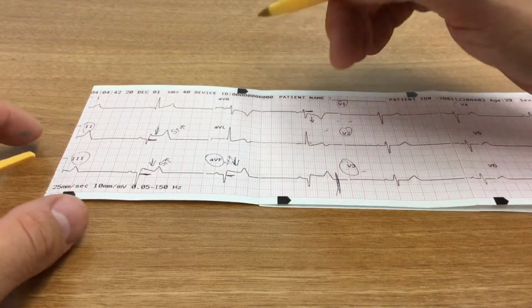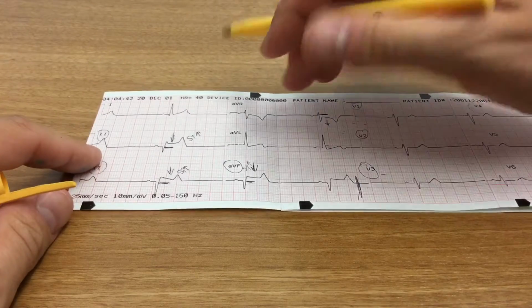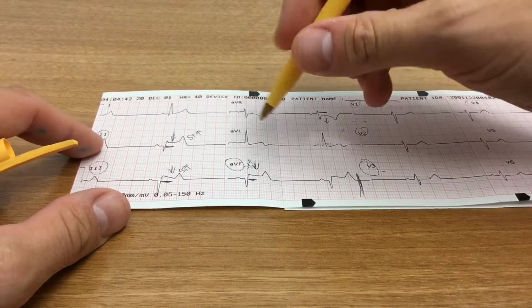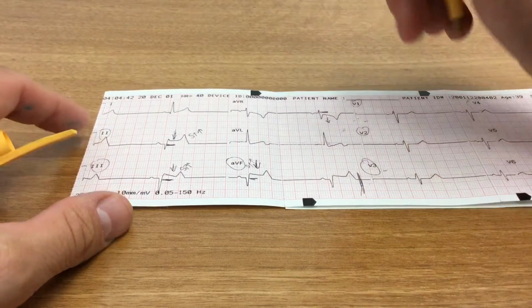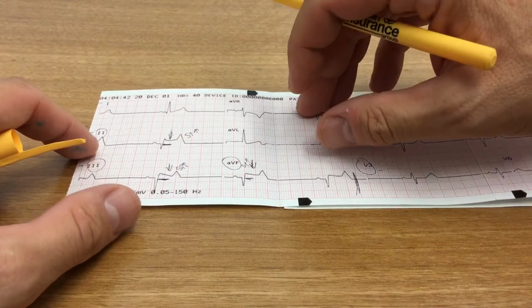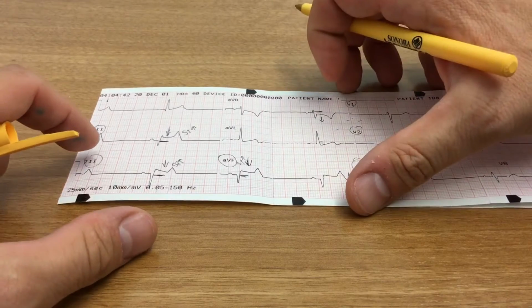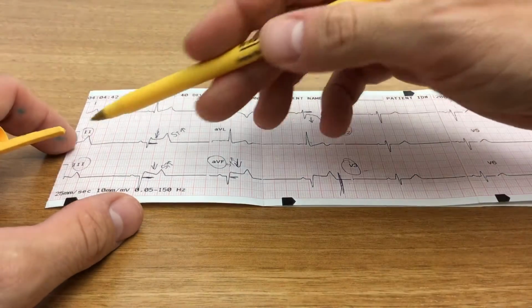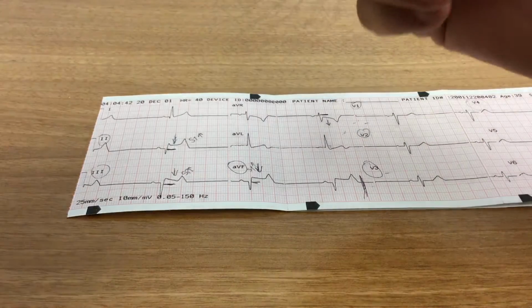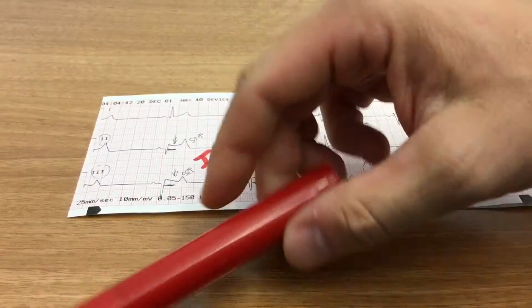So if our patient has signs and symptoms consistent with acute coronary syndrome, and this is what we were to see on our 12 lead, we would be reasonably sure this definitely points toward the hypothesis of an inferior wall ST segment elevation myocardial infarction, or inferior wall STEMI. So let's now go ahead and take a look at our other leads. So that's the inferior, right? We've done our inferior, and we definitely know that there's a problem in the inferior wall.